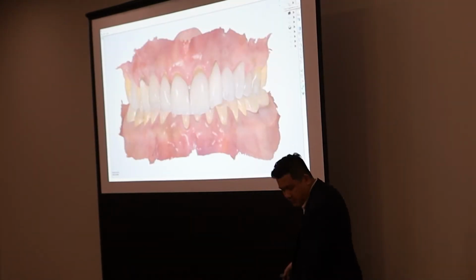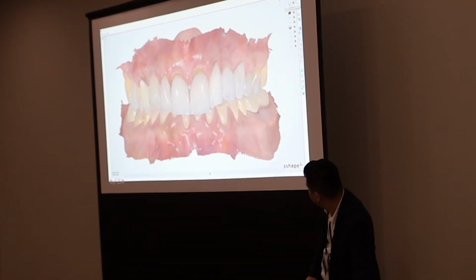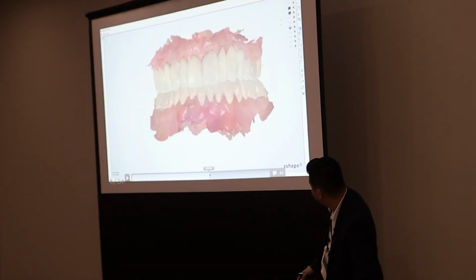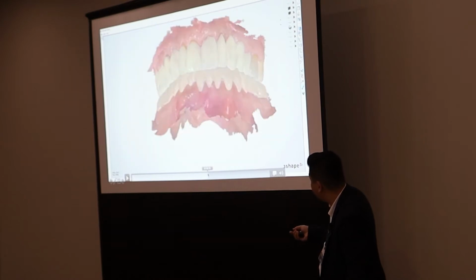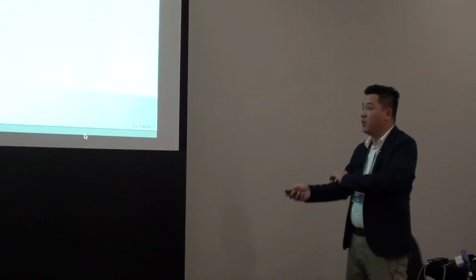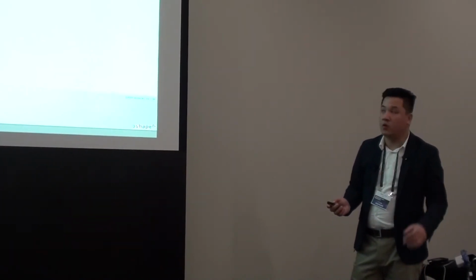But the new scan, you can see here, is not aligned. It's misaligned here. So what we want to do is, if we want to copy and paste our design and make it the most efficient, we needed to make a way for these to all align and correspond with each other. So what we do is we open up that dummy scan, import our original order, or import our original order scans at least.